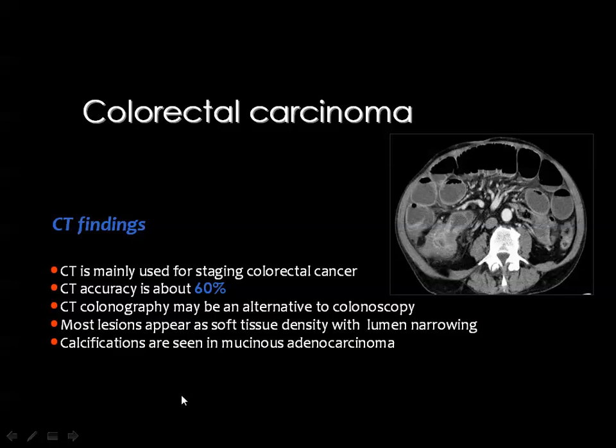And this may also be identified by CT scan. And you see, this is the region of the terminal ileum, and this is the region of the cecum. And you have proximal small bowel obstruction with multiple air fluid levels. Of course, you may mistake this appearance for typhlitis or even inflammatory conditions, but the clinical data and further evaluation by endoscopy are very important.